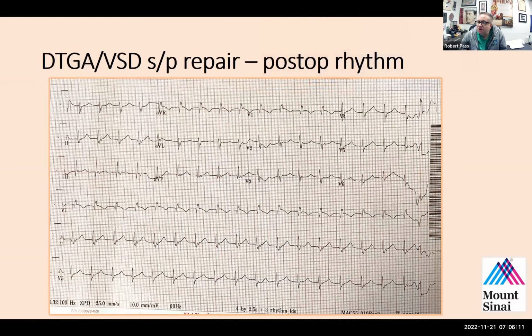Okay, so later that evening, the patient had this rhythm, and I was given a call. So I'm going to ask Tarek Zawani, Tarek, what do you think is going on here? And this is just a 12-lead again of the same patient, actually.